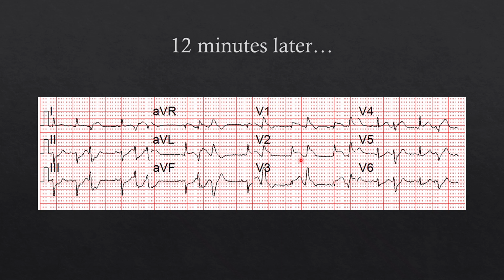We have bigeminal, sometimes trigeminal PVCs. We have obvious ST elevation, all of these things. Now, this happened in 12 minutes, so that made that decision easy, but sometimes this can take, again, 30 minutes to 2 hours to manifest. And so if we can get them going to the right place, they can be sitting at the PCI-capable facility, maybe even getting prepped for the cath lab when they finally fully pop that ST elevation.